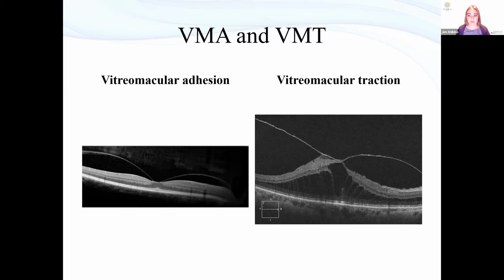Traction is where it's doing a bit of work, it's doing a bit of lifting. You can see those really stretched retinal tissues. So this one is probably going to be symptomatic. Now, mind you, you can get these dramatic pictures as well, and if their outer retina is relatively preserved, like this one, they may have very few symptoms. They may actually have no symptoms. I've come across that quite a lot. You want to, again, pay close attention to this outer retinal layer more than anything dramatic going on top.